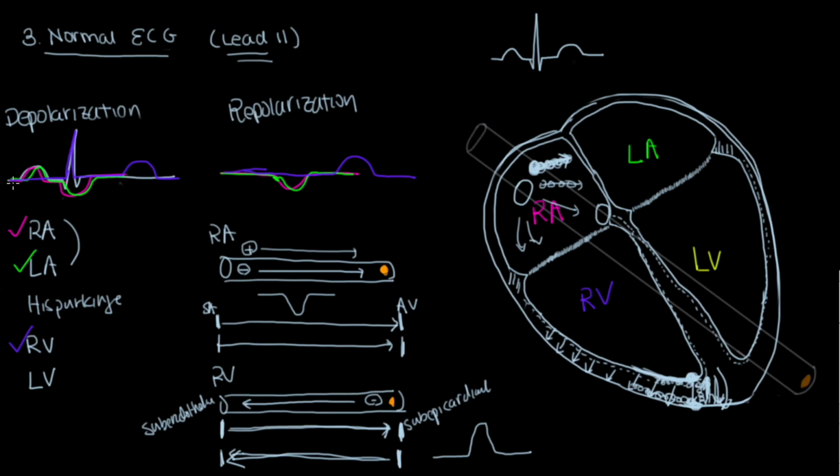What we had here was the depolarization happening slightly after the right ventricle, and then contributing to a little dip underneath, and then we repolarize as well. So what we have here, actually we shouldn't have drawn the depolarization stuff here, sorry. Continuing on here, and then repolarization.